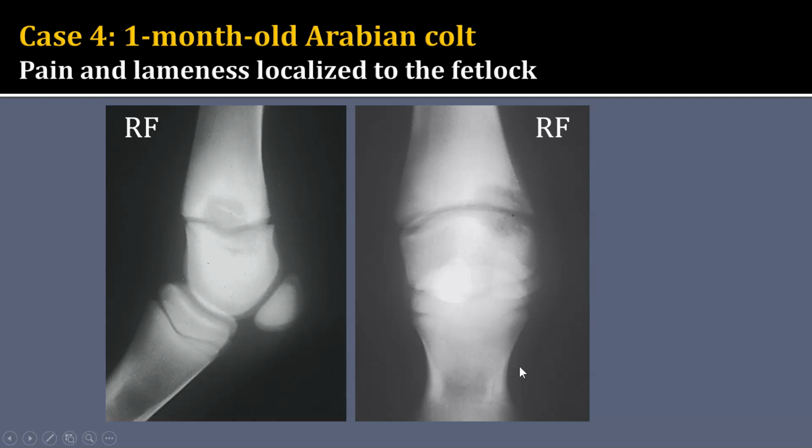So looking at this, it is a young patient, because this is the third metacarpal bone. It has an open physis. The proximal phalanx also has an open physis, so that fits. It looks like a horse, so that fits as well. Now it's going to be challenging. Looking at it, no alignment issues, but it's going to be challenging to look at the soft tissues on this study. However, I am going to point out that there is some soft tissue swelling that is predominantly extracapsular, centered at the level of the physis in this patient.